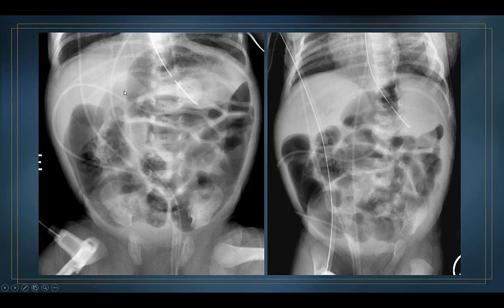But fortunately, most of the time, bowel does not usually overlie the liver, nor should it extend up above the level of the stomach. Because again, I've shown you exactly what's stomach here. So stomach obviously can go to the diaphragm, and generally you don't see small bowel loops extending up to the level of the central tendon of the diaphragm.